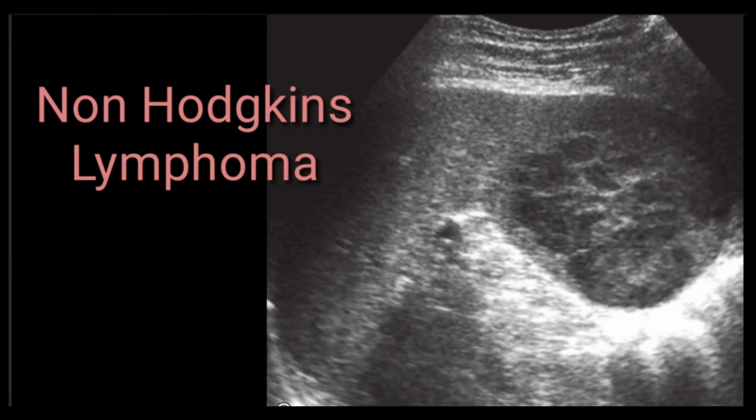This is the slide of non-Hodgkin lymphoma, and you can appreciate the spleen is mildly enlarged and an outpouching is seen. It is a bulky, heterogeneous, large, solid mass with central degenerative changes. As you know, lymphoma may appear as a diffusely enlarged spleen, or micronodules less than 3 cm in size, or macronodules if the nodules are more than 3 cm in size, and sometimes in the fourth pattern it appears as a bulky nodule or bulky mass. So this presentation shows a bulky mass arising from the upper pole. Write down the characteristics of the nodule, give your differential and recommend further radiological imaging for confirmation.